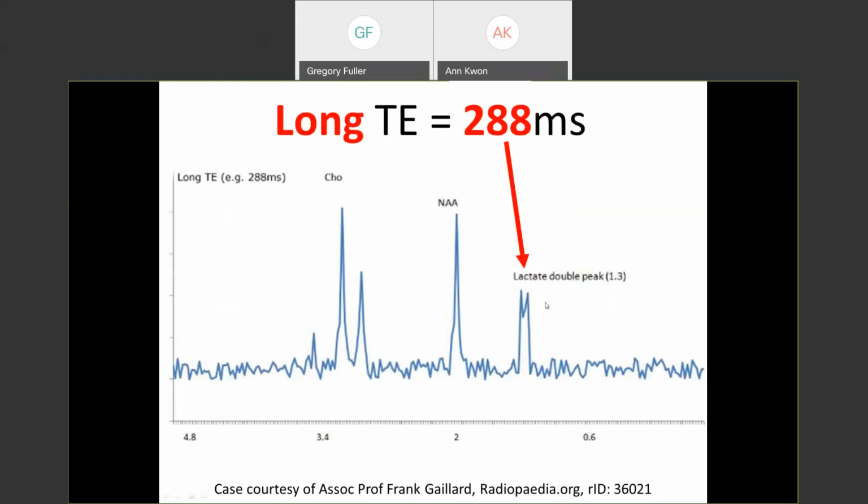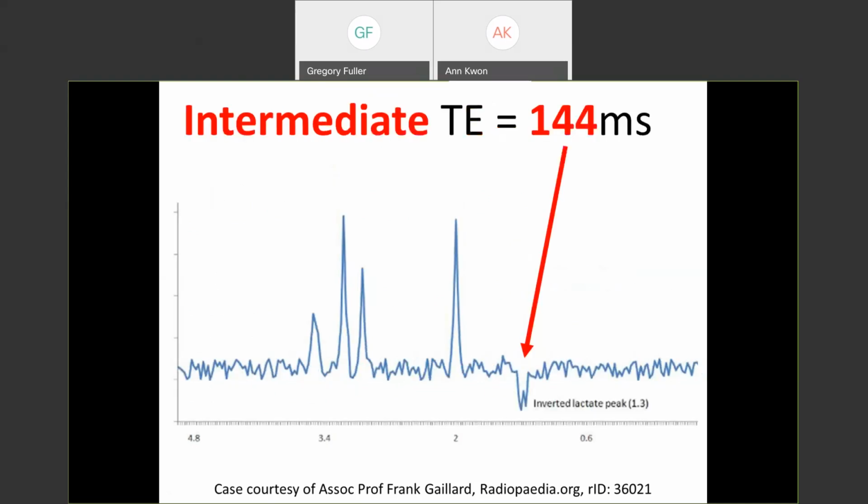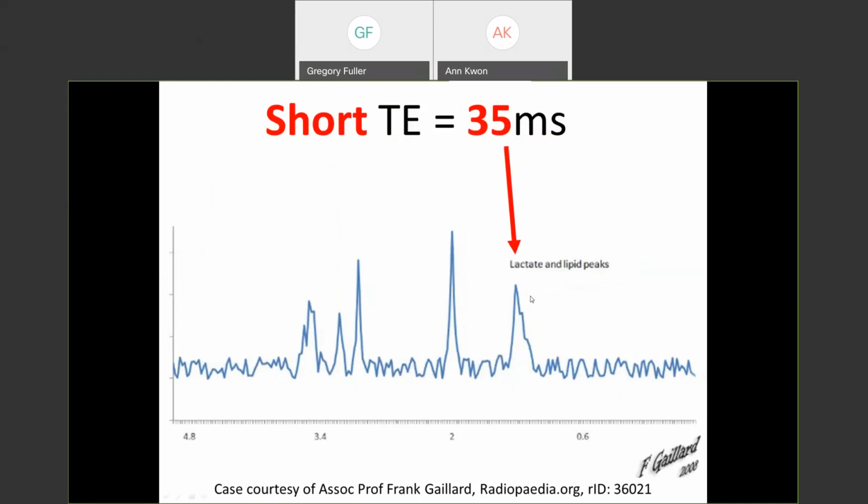Dr. Jason Johnson, one of our stellar neuroradiologists who co-runs the ABTI conference, likes to call this, I think, the fangs, like vampire fangs, or like a snake, the snake fangs, which is actually a tongue. Those aren't fangs. Yeah, I know that.